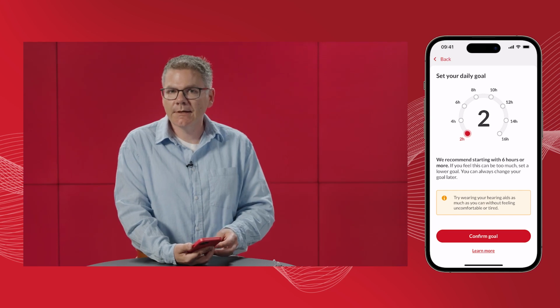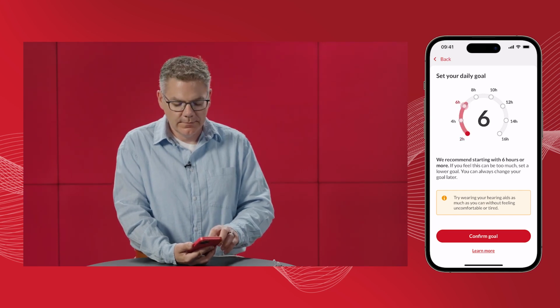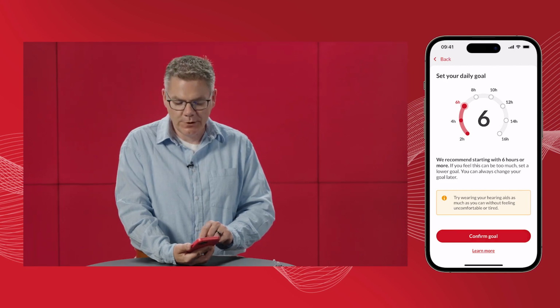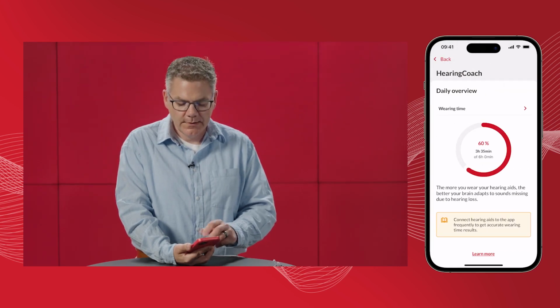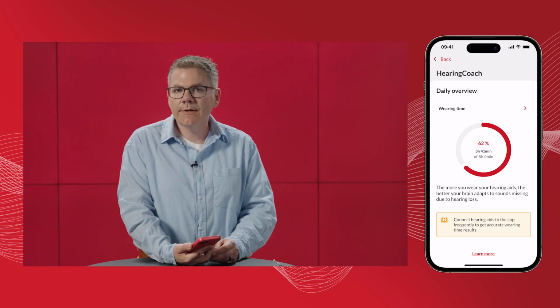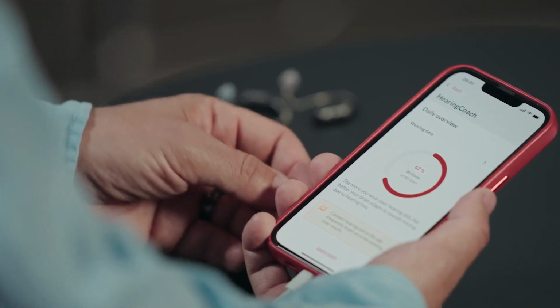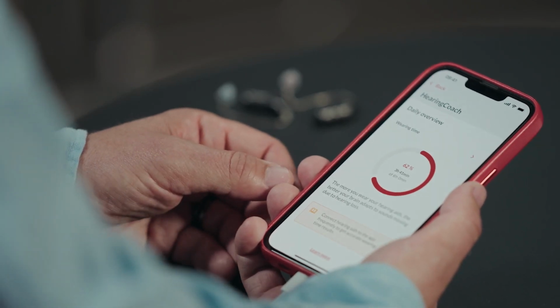We are then going to set a daily goal. And we'll set 6 hours. And then we will confirm our goal. Hearing Coach will then open to a daily overview of wearing time and how close you are to that goal.